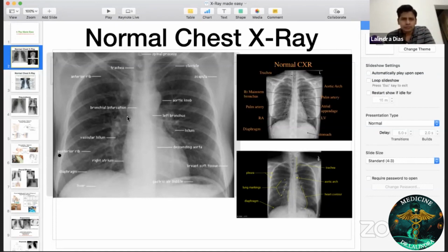Then that is the right lung. Then the left lung also, you start at the apex, go through the periphery, go to the costophrenic angle, come along the diaphragm, and come along this hilar border and go to the top. So look at the left apex, that is left upper zone, left mid zone, and left lower zone. What you have to see is whether there are increased black color shadows or increased white color shadows.